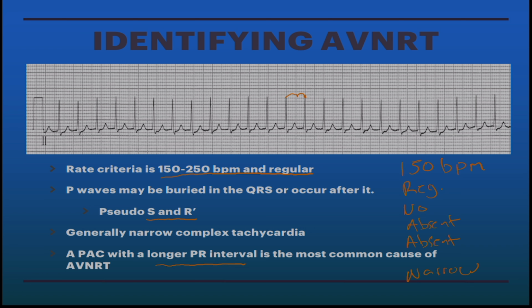Yeah. And then I'm going to take another look, and I'm looking at lead 2, and on this EKG, you can see this slurred S wave in all of these leads. Almost makes it look like the QRS complex is wide, but really what we're seeing is that retrograde conduction of the P wave. As it slows and comes through, it just occurs during this QRS complex. So this would be an example of AV nodal reentry tachycardia, which is a form of supraventricular tachycardia.